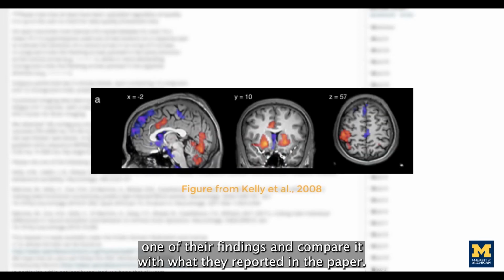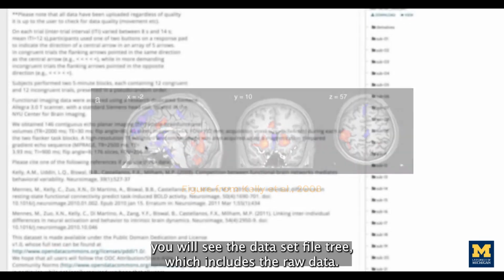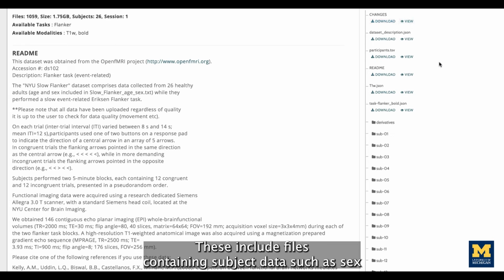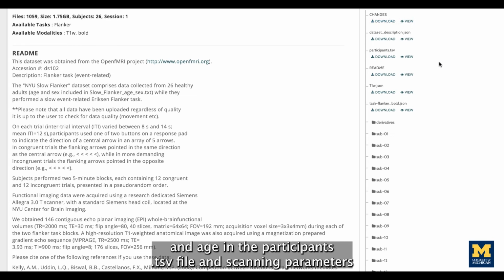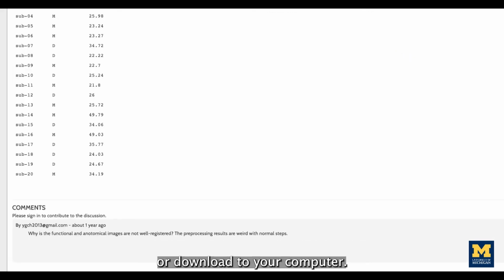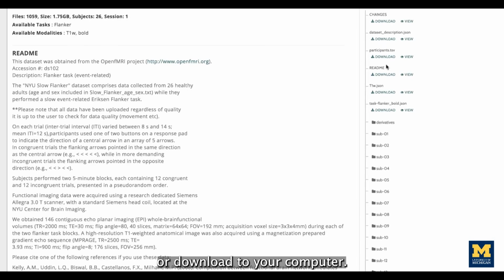To the right, you will see the dataset file tree, which includes the raw data. These include files containing subject data, such as sex and age in the participants.tsv file, and scanning parameters that can be found in the task flanker_bold.json file, which you can either view in the web browser or download to your computer.